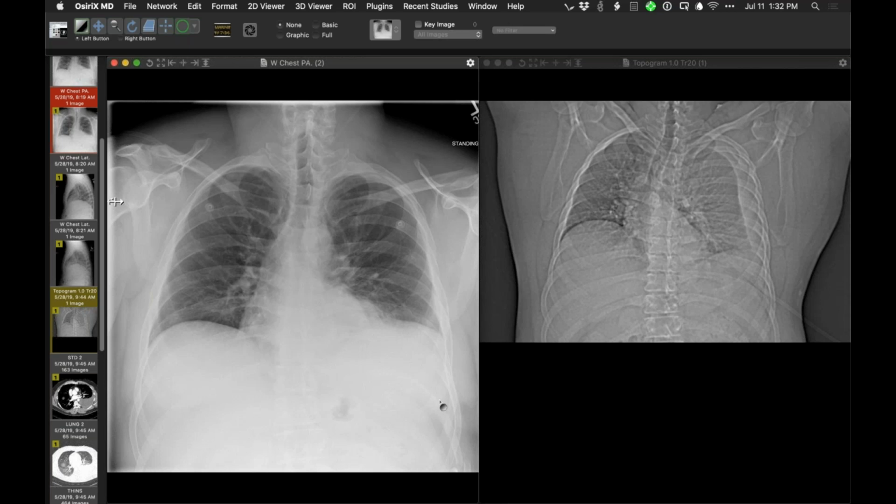So this is a really nice example of a lot of left subpulmonic pleural fluid. And certainly on the left side, if there is gas in bowel and there's no other subphrenic pathology, that's the tip-off that there's something here. It's not just this that has to be accounted for. So this is a nice example of a substantial amount of left subpulmonic pleural fluid.